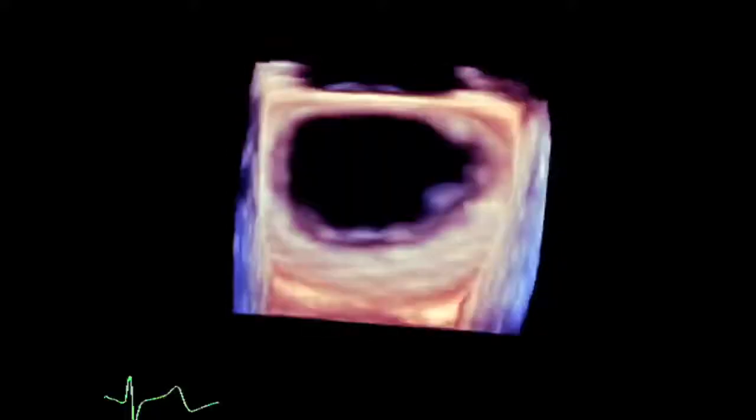We're asked oftentimes, and in this image, we're asked to determine what type of pathology has occurred with the patient with mitral valve regurgitation. In this image, you can see anteriorly the anterior leaflet, and you can see this ruptured cord or this tear around 1 o'clock. It's extending down into the valve plane. The posterior leaflet is the bottom part of this screen.